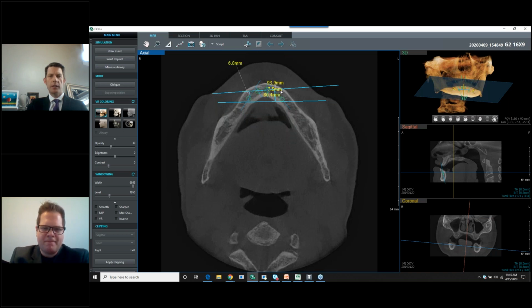And now we know that we need to change either 1.5 times that number or 2, depending on the material we're using and the individual setup. I know there's a lot of different clinical questions here. In this, we're just showing how to use the software specifically for the Vatech, what we can do with our software here. So let's go up to there, and then we would draw another line across. And that's going to be our distance for our AP spread specific to that.